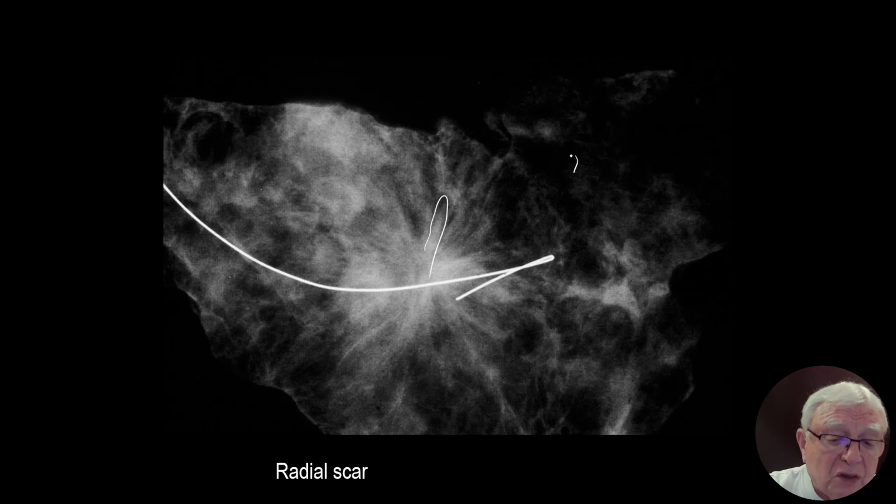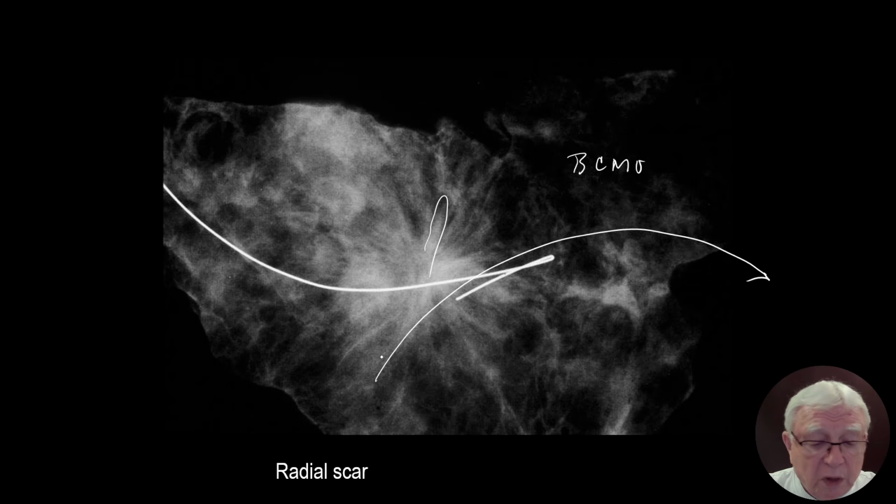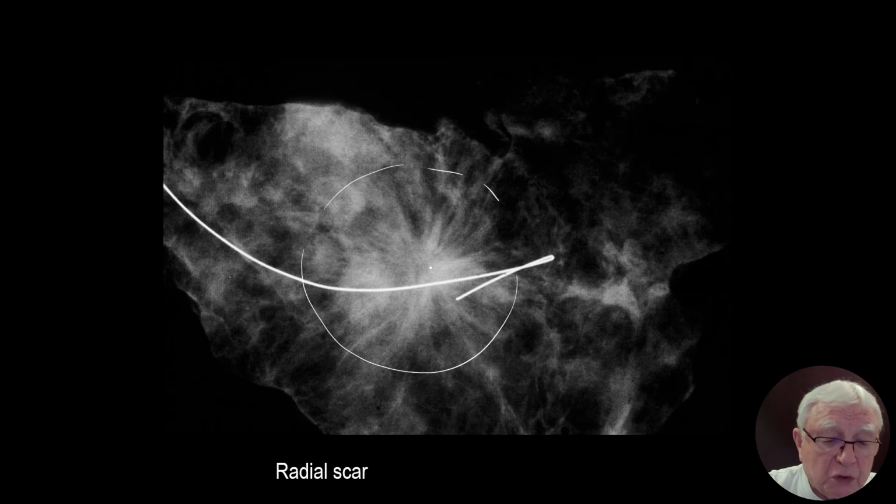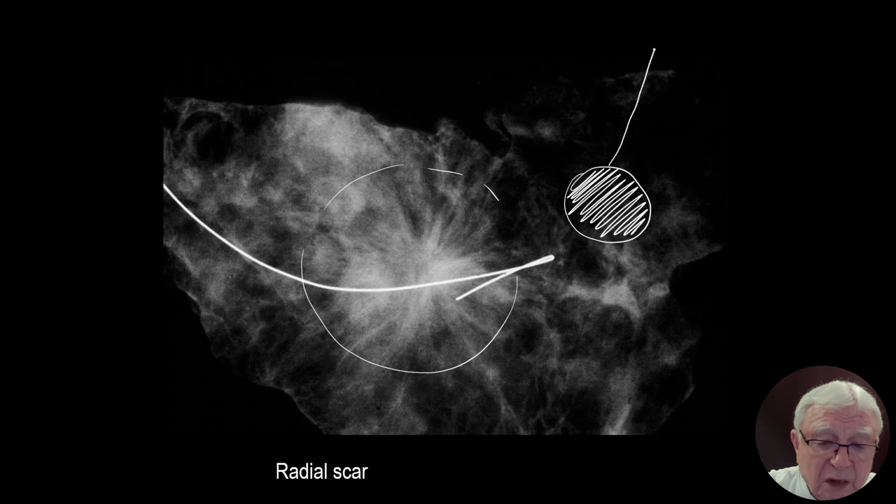I know that this is not going to be a breast cancer of mesenchymal origin, first of all, because it was localized. You remember, BCMO is the disease of the very structure of the breast. We learned that we should analyze the central portion and the radiating structure. The AAB of this size would have this big central tumor mass and very determined straight Eiffel Tower-like spiculations. No, this is not.